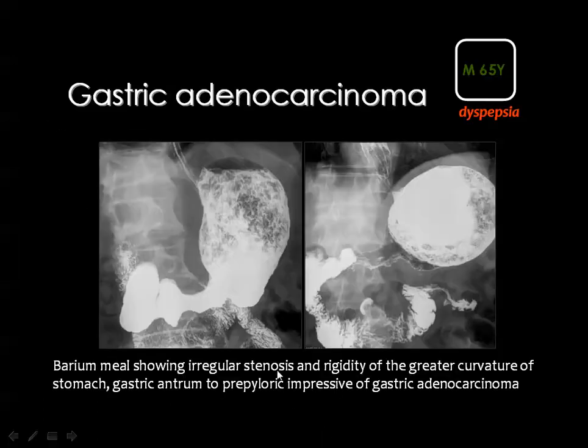And in this case, you see an infiltrating type of gastric adenocarcinoma involving the distal part of the body and the pyloric canal. And proximal to this carcinoma, there is a lot of retained food material within the fundus and the proximal body. And in the mucosal relief film, you can see the irregularity and the destruction of the mucosal folds in the affected area.